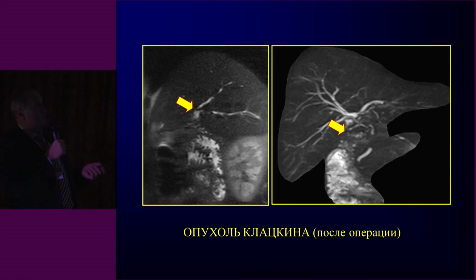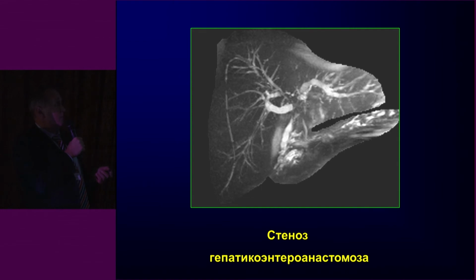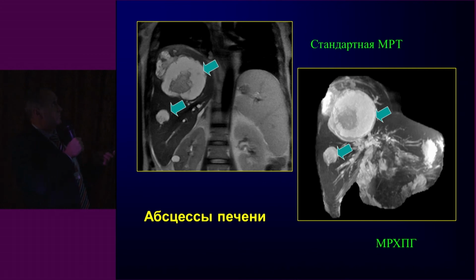The patient underwent surgery. The tumor was resected. The patient is alive already 8 years. And it's important because here the surgery is done with the appropriate approach. And here, unlike previous patients, it results in stenosis. And stenosis could result in such considerable changes in the liver.